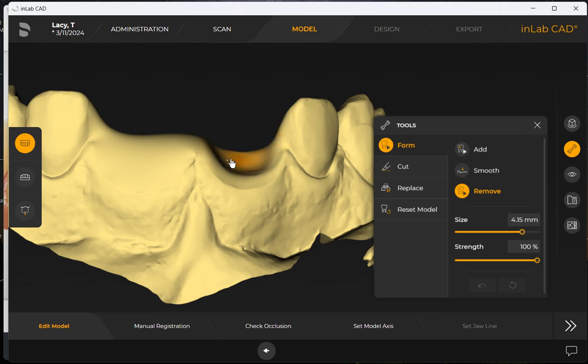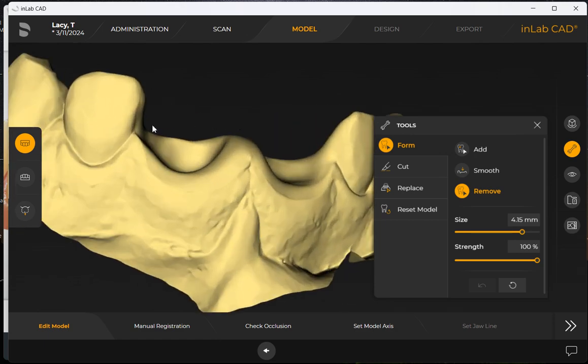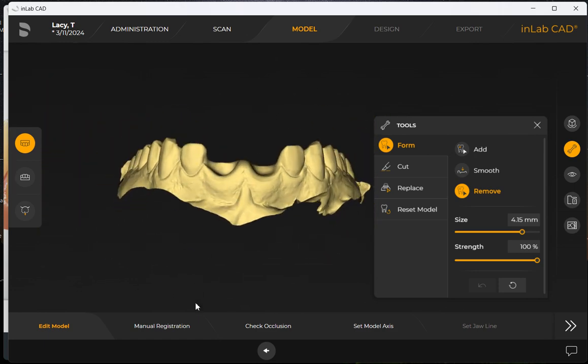This is just like we used to do when we would put a denture tooth on a model. We're just doing the same thing digitally. It's pretty straightforward, pretty easy, right? So now we've got some nice ovate Pontics, and now we should have something that's going to create a nice diagnostic digital wax up. We go to the manual registration screen.